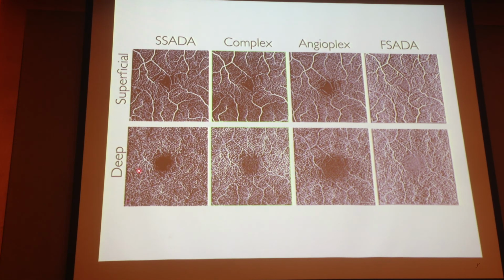Sorry, from this one and this one. Yeah, the black zone, like the lower third. This one. Well, the second one, the complex, yeah. And then you can see that in the picture of the superficial plexus, the lower half, like the lower third, this part, this zone. Yeah, that actually can be uneven exposure. So if you're not perfectly aligned, you can get such a thing.